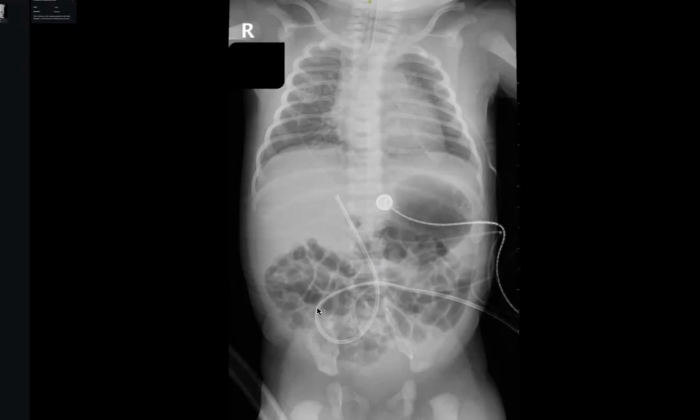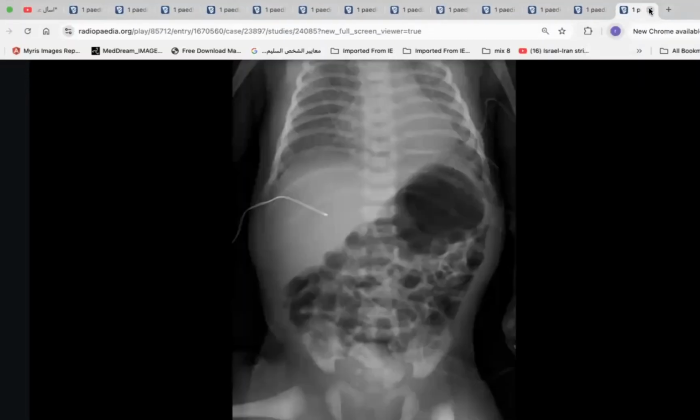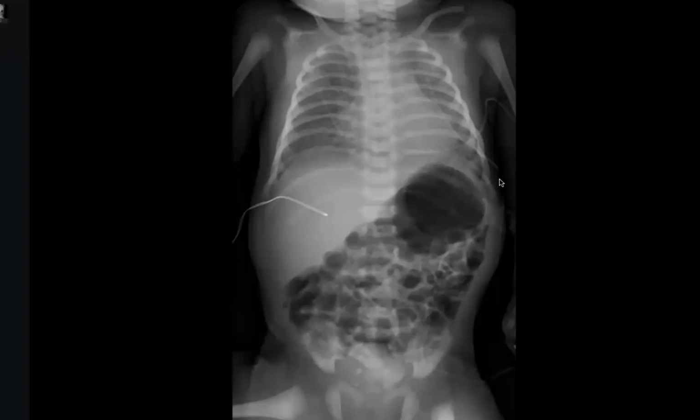And this coil, I think, is from outside the abdomen. Why, in the umbilical artery catheter, should it go down first? Because the umbilical artery is connected to the iliac, so it goes down and then goes up. Thank you, doctor, so much. Next candidate.